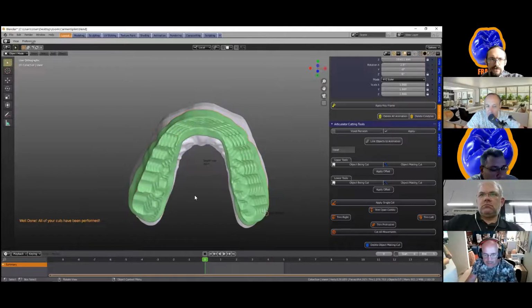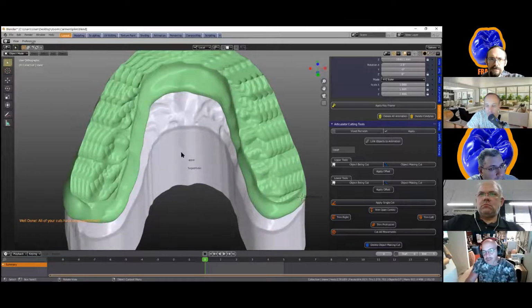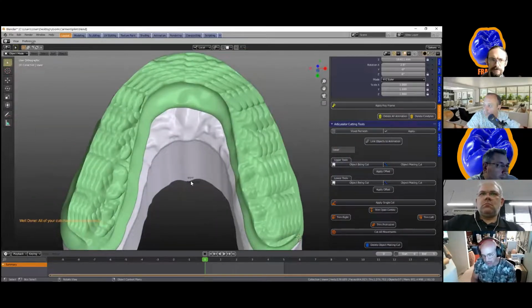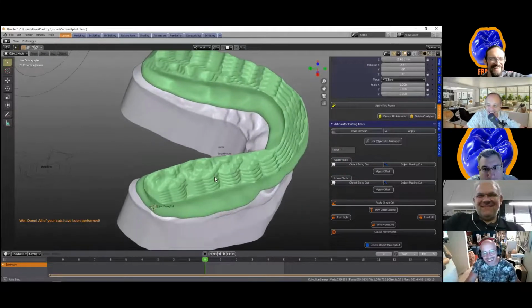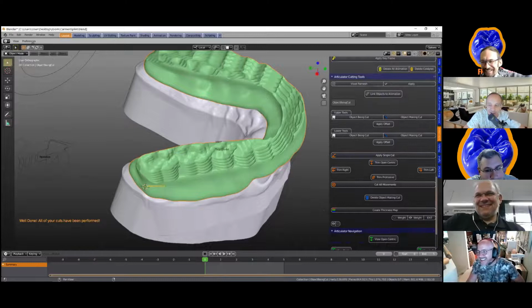All right. So let's examine this beautiful trimming here. Of course, you don't want to print it like that, because you're going to have to polish it with a pumice and get your hands dirty, and that's not our objective anymore in the digital world. We don't want to get our hands dirty. We've had enough of this, Wolfgang, in the past. Didn't you like polishing dentures? No comment. I thought you were good at that. No comment. Oh well, I'll have a chat tomorrow, Michael.